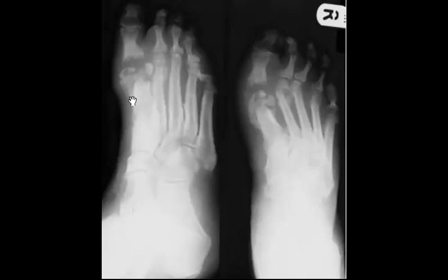They mentioned that the typical diabetic fracture, as in this case, is a subchondral fracture of the metatarsal head. This is the usual location of diabetic fractures. They sometimes call it diabetic fractures. Subchondral fracture of the metatarsal head, especially the second one. And maybe the posterior calcaneal tubercle with an avulsion fracture. Sometimes they have something called talocalcaneal fragmentation. I will show you now.